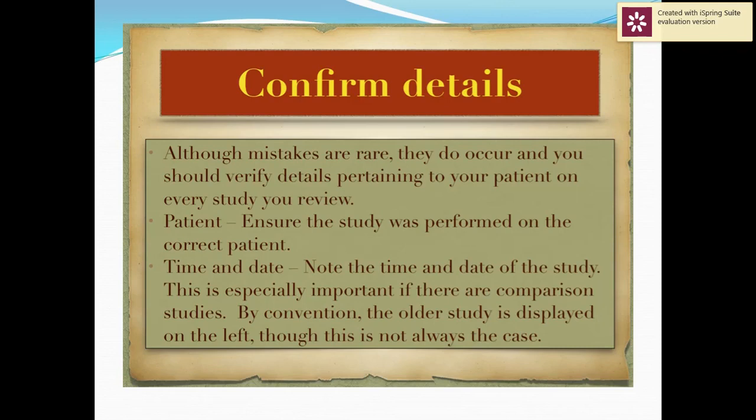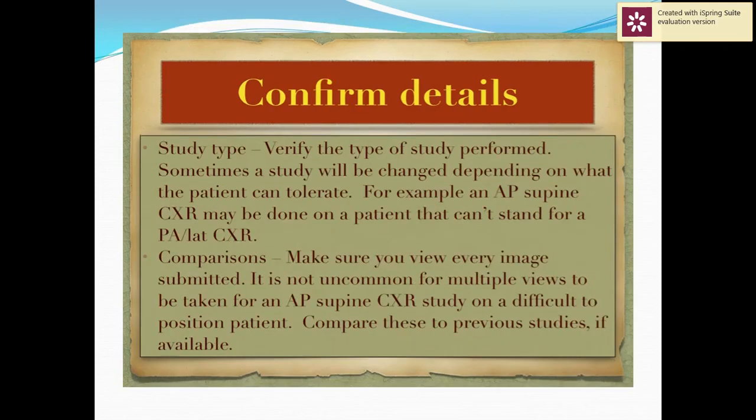You check for the first chest X-ray, and if there is any obvious time difference between progressive lung pulmonary nodule, الناس اللي عندهم tumor, follow up, non-resolving pneumonia is important also to compare between the previous chest X-ray.